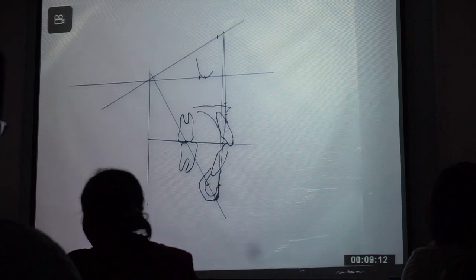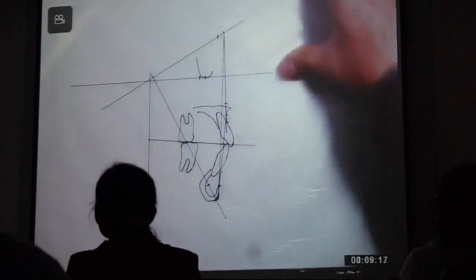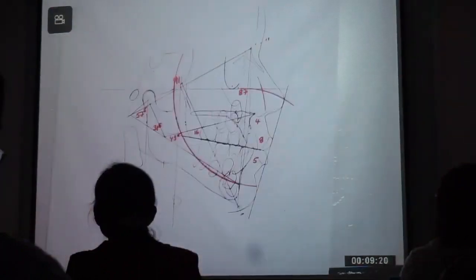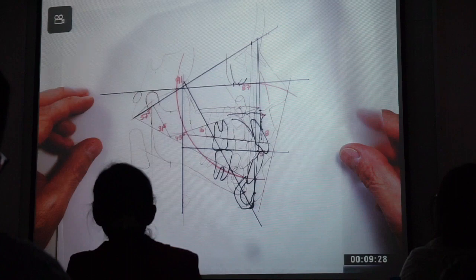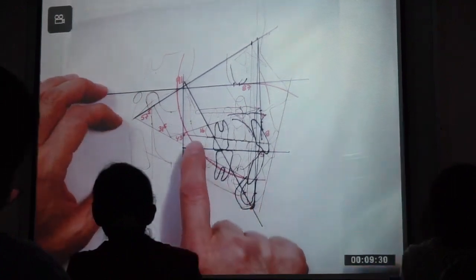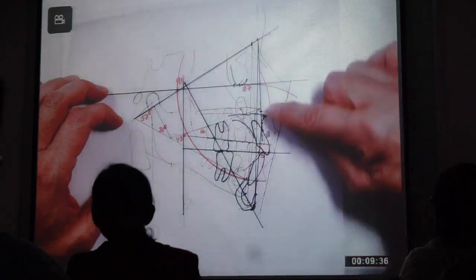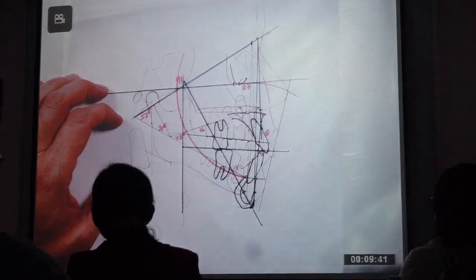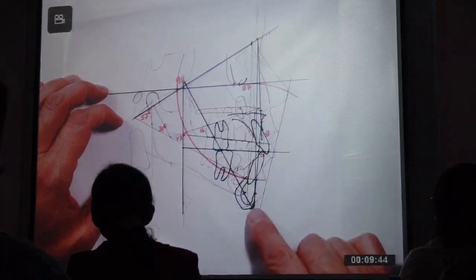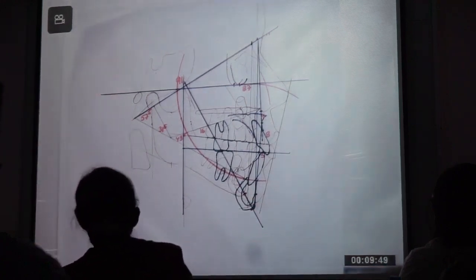This is simplified VTO. What is the use of this? If I see this is the original patient, quickly I can put this in place and I can see the occlusal plane going down. Oh, I like it. I can see the parallel drop of the palate. I can see how much the mental is going to grow. This is with normal growth.